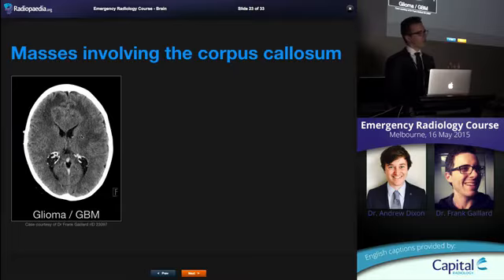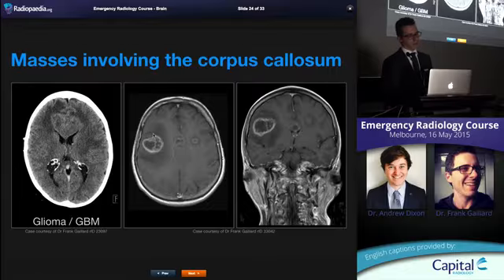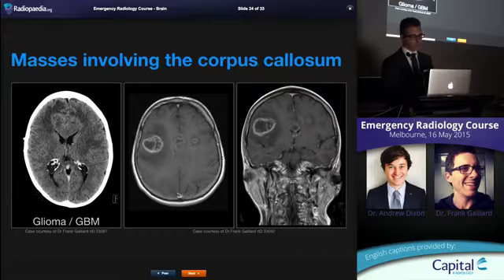It's such a good sign, corpus callosal involvement, that if you see a patient like this that has 3 lesions that individually all look like metastases, even if they weren't all in a nice row like this along the white matter fibres that are crossing, you could be quite confident that this was a GBM and not metastases. And in this case, because they're all aligned in the direction that you'd expect white matter fibres to cross from one hemisphere to another, and therefore the direction along which you expect tumour to spread, you can be almost certain that this won't be a metastasis. So there's no point going to do a CT, chest, abdo, pelvis and waste your time looking for a primary that's not going to exist. They just need a biopsy and then move on to treatment.